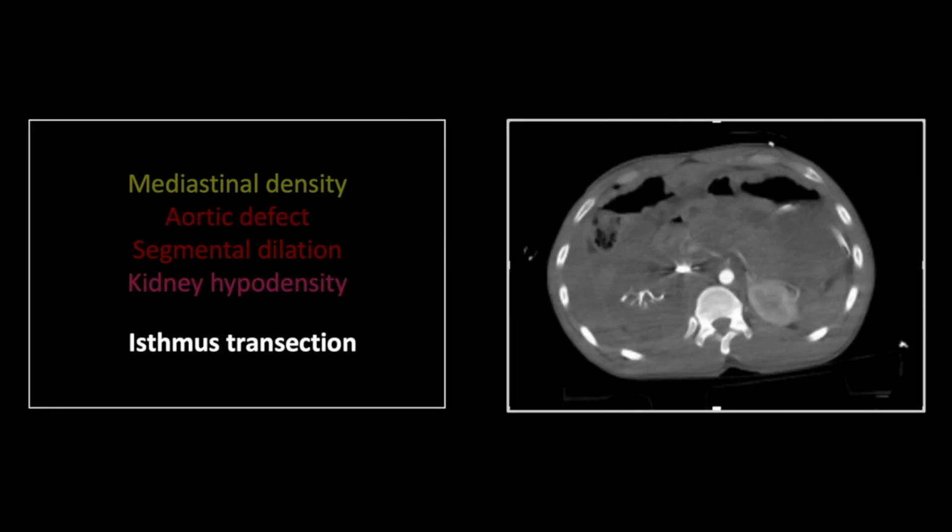This patient also has a hypodense right kidney with an absent arterial nephrogram in comparison to the visualized left kidney. The presence of contrast backflow in the inferior vena cava suggests that the right renal venous backflow is physiologic rather than being related to an arteriovenous fistula. In either case, there is clearly an avulsion of the right renal artery that is not visualized.